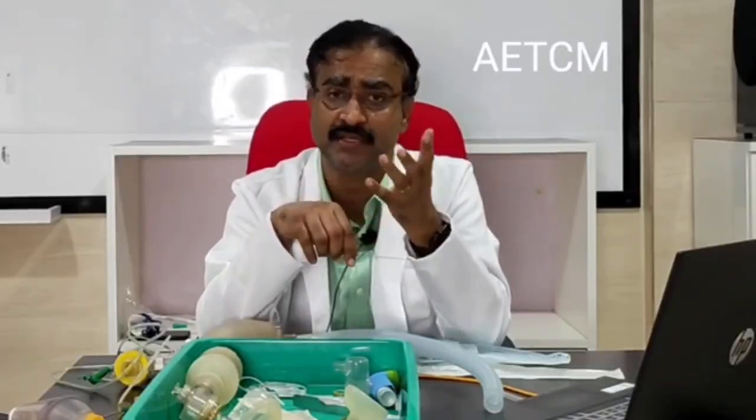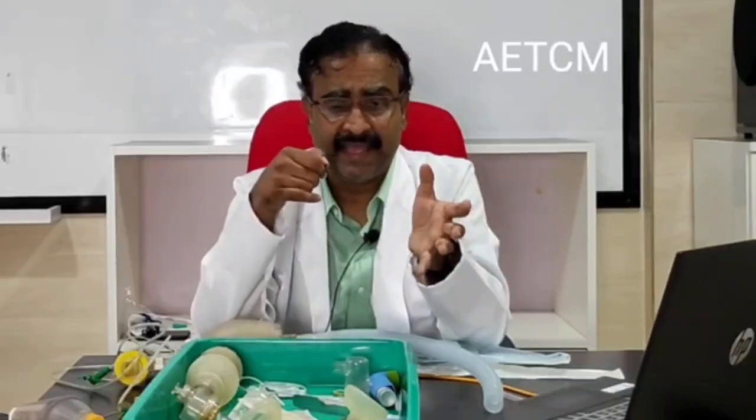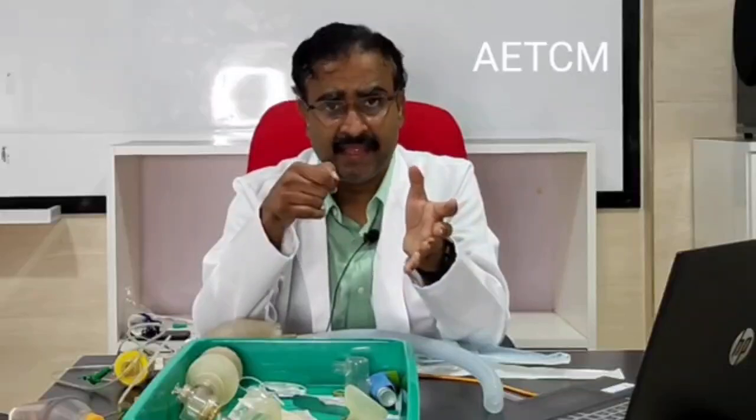Children who have coagulopathy, severe coagulopathy or bleeding disorders, this is a relative contraindication. The lumbar puncture is a relative contraindication. In those children who have thrombocytopenia, again the lumbar puncture is a relative contraindication. So the complications of doing a lumbar puncture are pretty clear. You may even cause a traumatic lumbar puncture. You need to be very careful. So the positioning of the baby, the site of insertion and the piercing into the LP space becomes very, very crucial to get a CSF. So this is about a lumbar puncture needle.